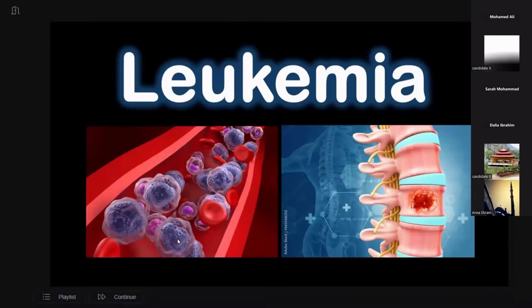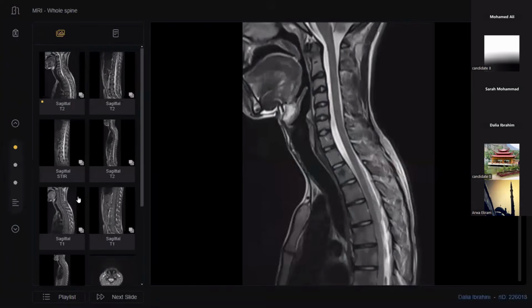Hyperproliferation outweighing the blood supply. Actually the tumor cells cluster and form tumor emboli, leading to closure of the blood vessels of this vertebra, leading to this appearance of the bone infarct. And actually this patient was proved to be acute lymphoblastic leukemia.